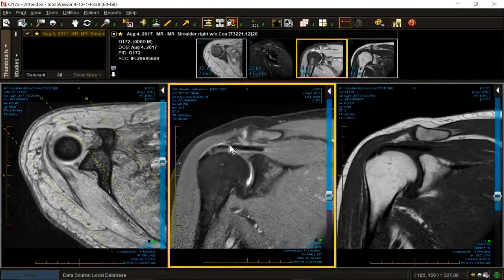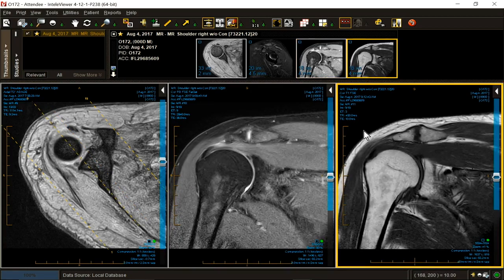HAD is usually on the outside, where the superficial surface of the cuff is irritated or rubbed, not usually within the cuff itself. It's usually a peritendinitis. So this is one of the few examples that you'll see of intratendinous HAD as a manifestation of outlet-related impingement syndrome. What else do we have in this case? We had some AC joint disease, but everybody's got that.